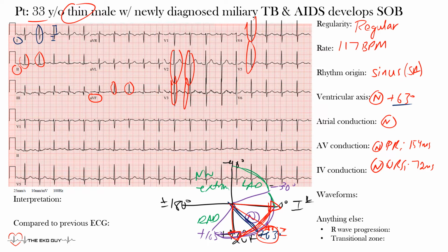Now, in terms of the T waves, they're normal here. They're asymmetric in morphology, that slow upstroke and that steeper downslope that we want to see. Okay. And lastly, with the waveforms, the QTC interval was actually slightly prolonged here, calculated to be 456 milliseconds. Remember, normal QTC interval in males is less than 440 milliseconds. In females, it has a little higher upper limit, about 460 milliseconds. So overall, when we look at the waveform abnormalities, what we see here is a slightly prolonged QTC interval, okay? And we said here that it was 456 milliseconds.